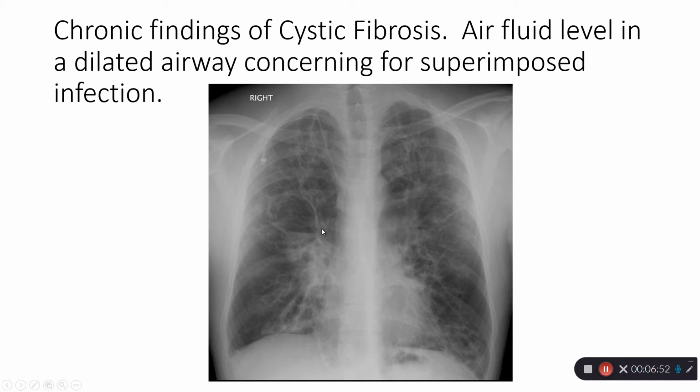Anytime you see an air fluid level within the lung, we're worried that there could be a superimposed infection, either within a dilated airway, like in this case, or in a pulmonary abscess or pre-existing cavity.